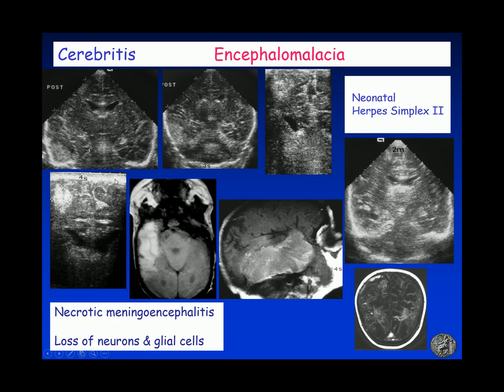And please be careful, if they are very bright on ultrasound, please think of hemorrhagic foci. This is cerebritis associated with hemorrhage, and this very hyperechogenic foci suggests the presence of hemorrhage, and this gives rise to encephalomalacia later on that you can beautifully depict on MRI.